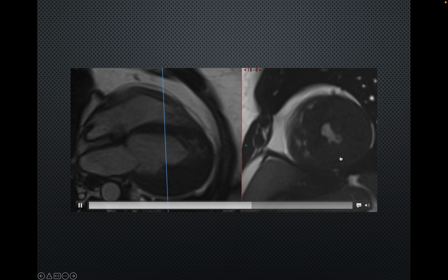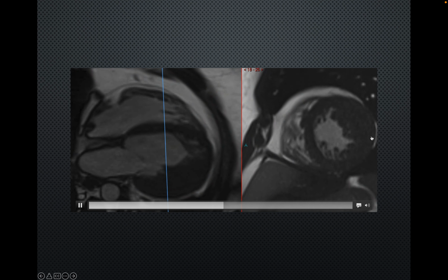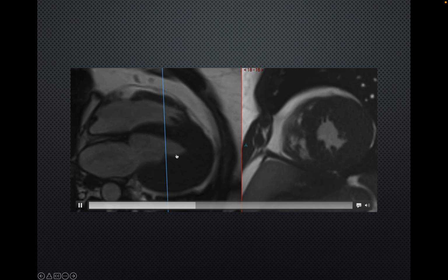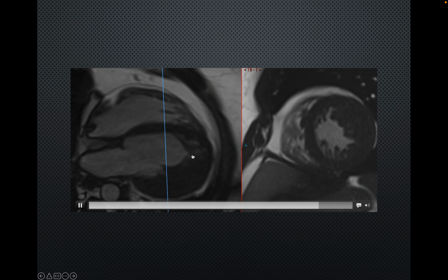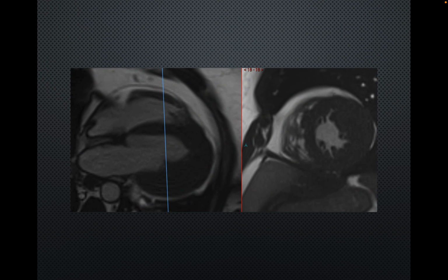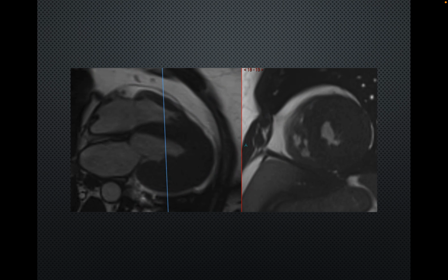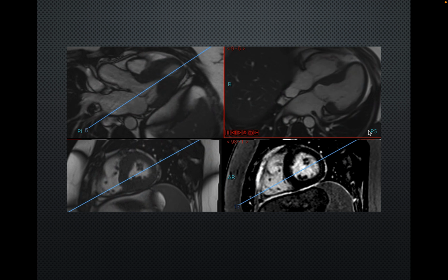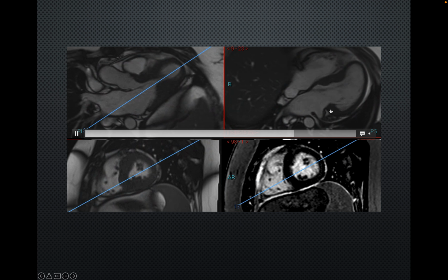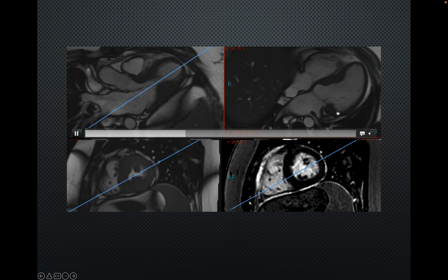Again, here the thickening was along the anterolateral wall rather than the anteroseptum and septum. As you may see, there is excessive trabeculation. This is a recent case, and we were not sure whether this is just excessive trabeculation or there is coexisting non-compaction myocardium. Another form of dumbbell-shaped septum and hypertrophy, again along the lateral wall at the basal level.